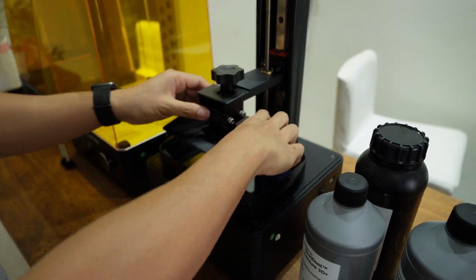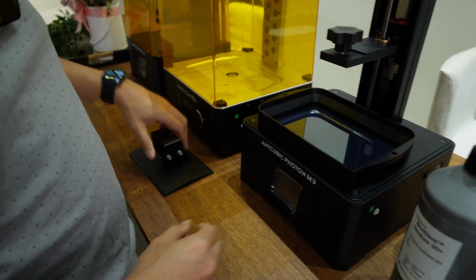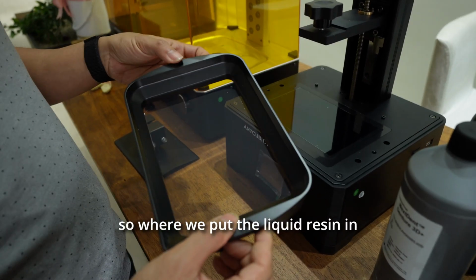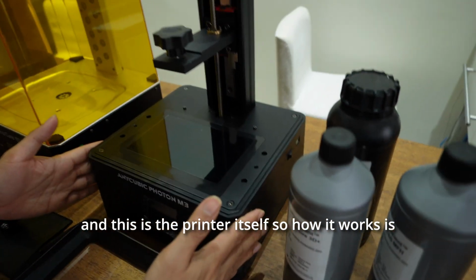Okay. This is what we call a build plate. This is the resin vat, where we put the liquid resin in. And this is the printer itself.